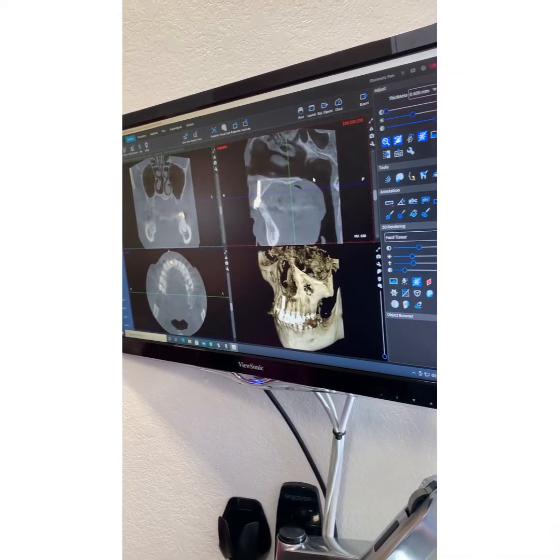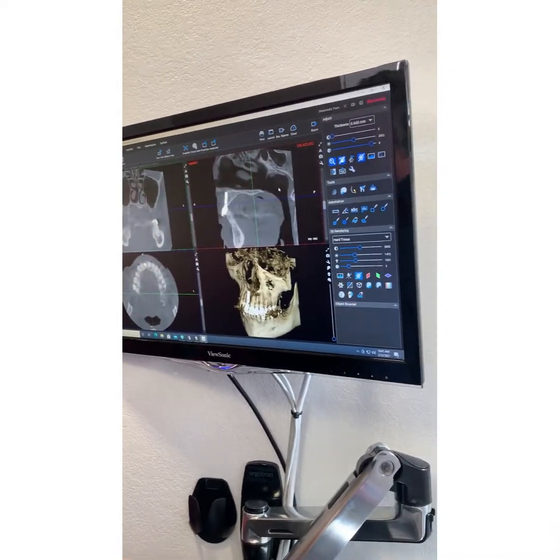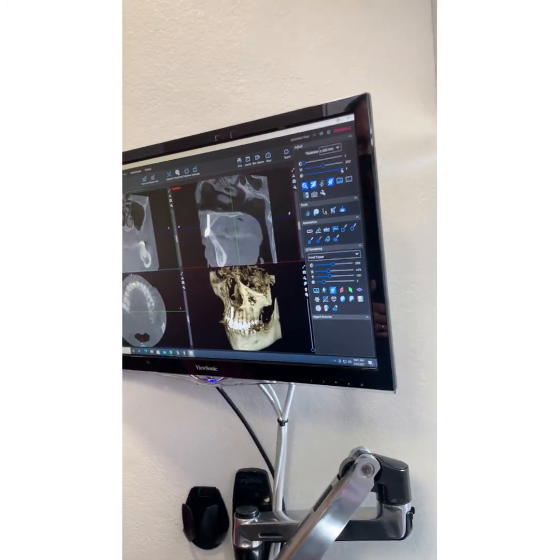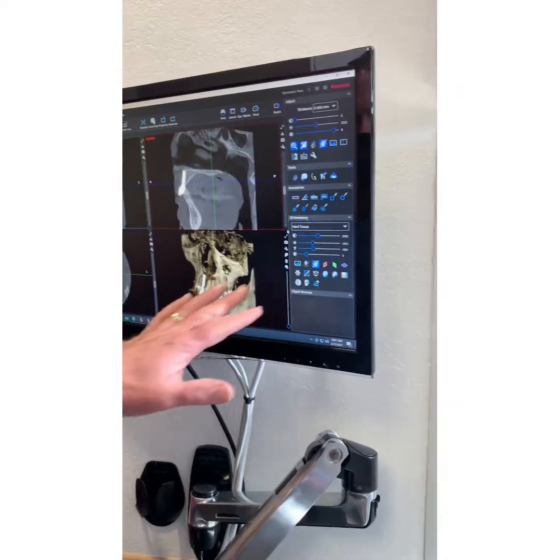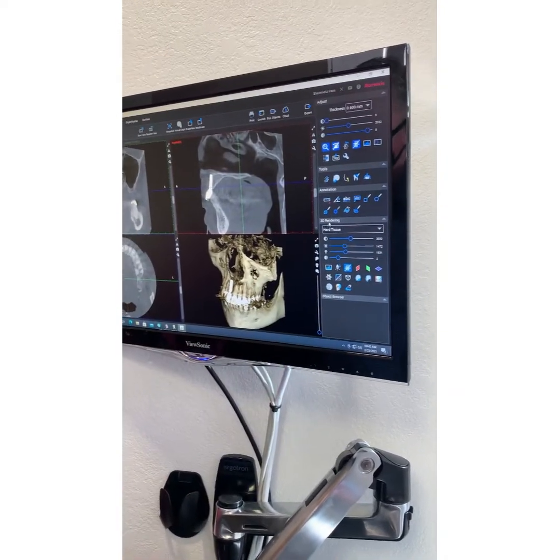This is all for him, that's nothing to do with us. But what you guys might want to do is make an adjustment, making these slices a little sharper with this slider, or reducing some of the noise with this slider. That's the rest of it is going to be for him.